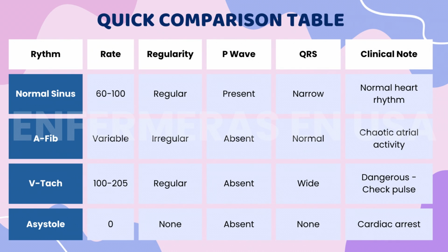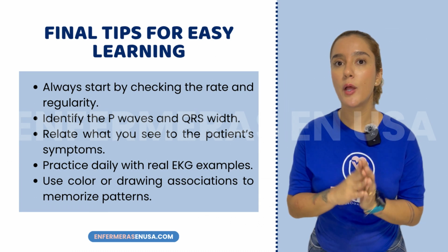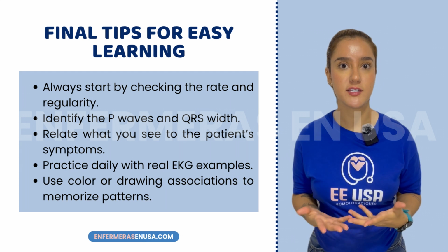Here's a quick comparison according to rhythm, rate, P-wave characteristics, QRS complex, and finally, key notes for each rhythm. Let's remember, interpreting an EKG is not about memorizing shapes. It's about understanding what the heart is trying to tell us.